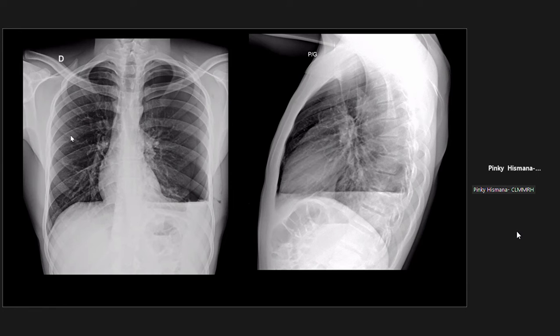That's why compared to this one, which is more lucent, your left lung is a bit hazy because of atelectasis or partial collapse secondary to the pneumothorax, or air in your pleural space occupying the mid and upper portion of your hemithorax. On the other hand, on the lower portion of the hemithorax, you have fluid here.